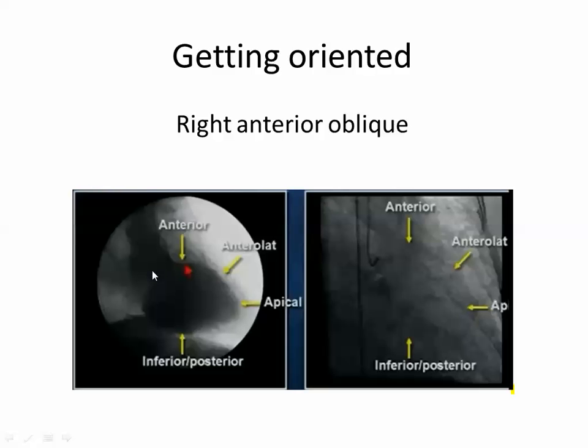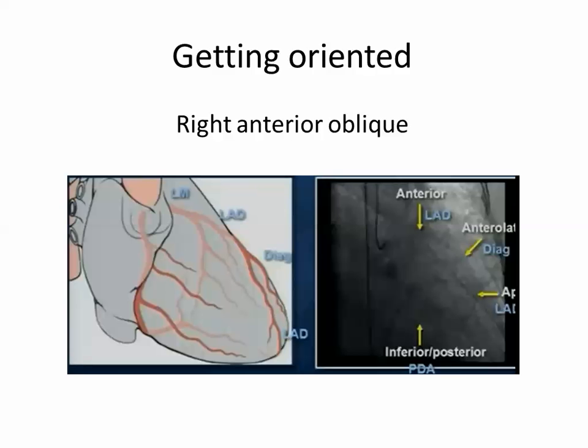Here, as a circle. And this is the interventricular sulcus. So the LCX will be here and the RCA from behind, with continuation with the LCX in the same way. So this is the atrioventricular.